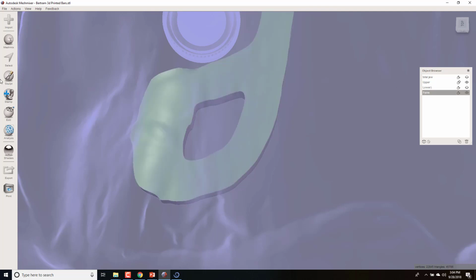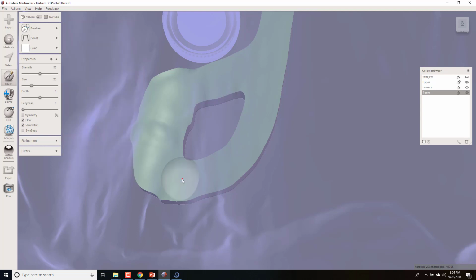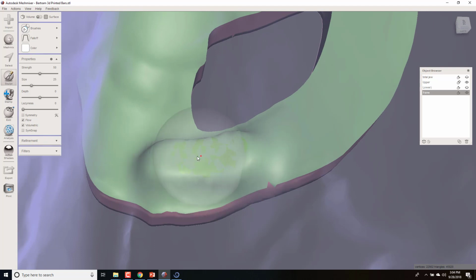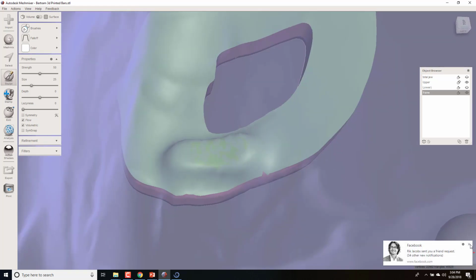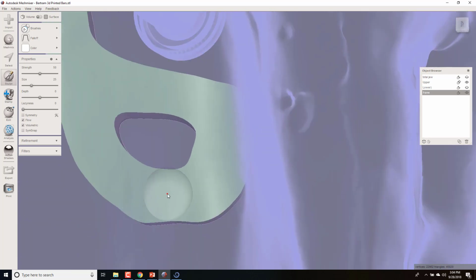the objects browser, go to Sculpt, use your brushes, and use this attract tool. We're going to use the attract tool and now just pull off some tissue stops right there. Do you see how the mesh just changed a little bit? That means it just came into contact with this model which I have magnetized. Come over here and let's do the other side of the tripod.